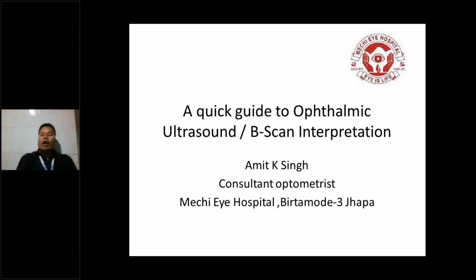Home quarantine, and today I would like to talk about a quick guide to ophthalmic ultrasound, that is B scan interpretation.